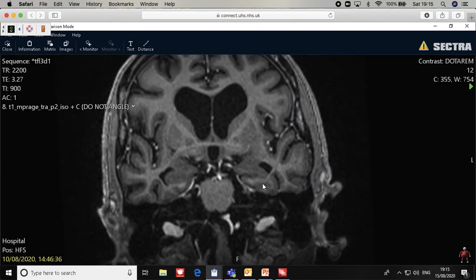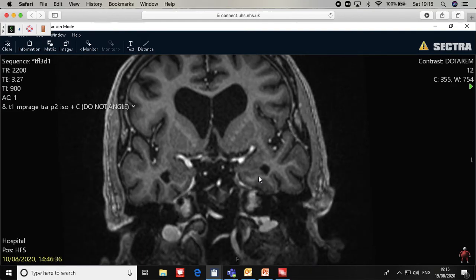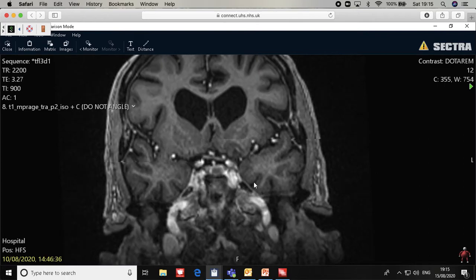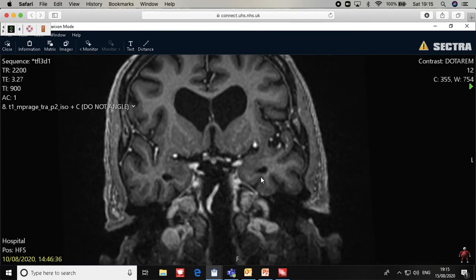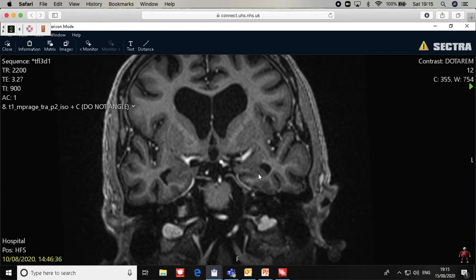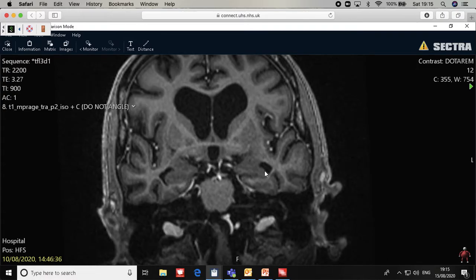Yeah, I think we are now anterior, in the amygdala. Yeah, it's correct. So any gray matter anterior in the temporal lobe will be the amygdala. You don't have to take it into consideration. Okay. So just draw on the floor of the lateral ventricle.